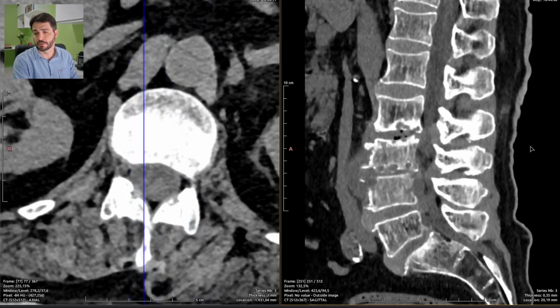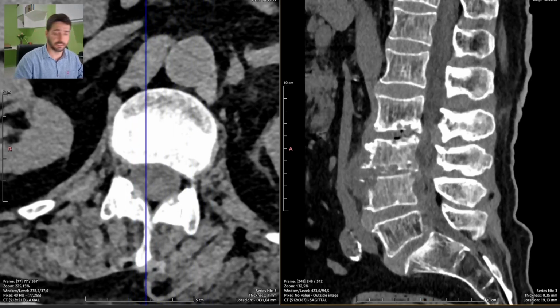So let's report it, because this exam, no matter how hard it is, won't report itself. Yeah, coffee always helps. So I'm going to grab one of my templates that describe severe disease, and I'm going to report it.